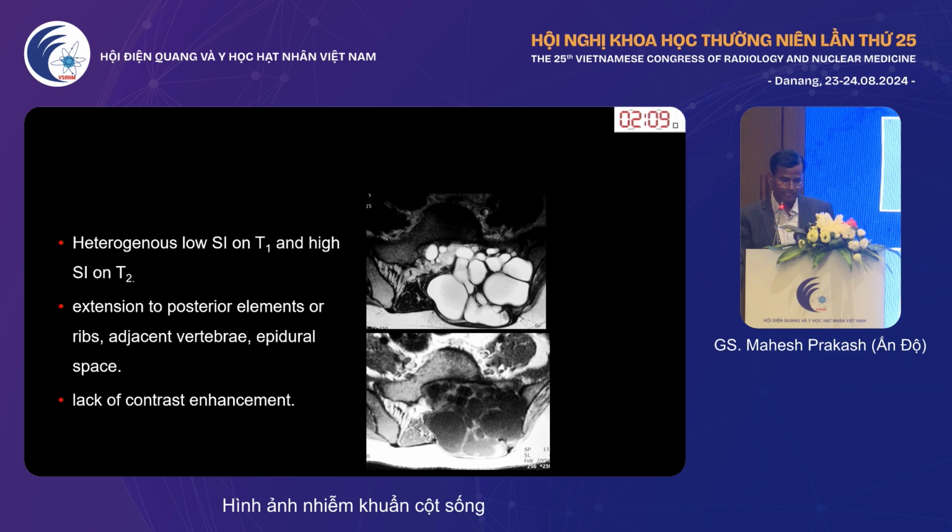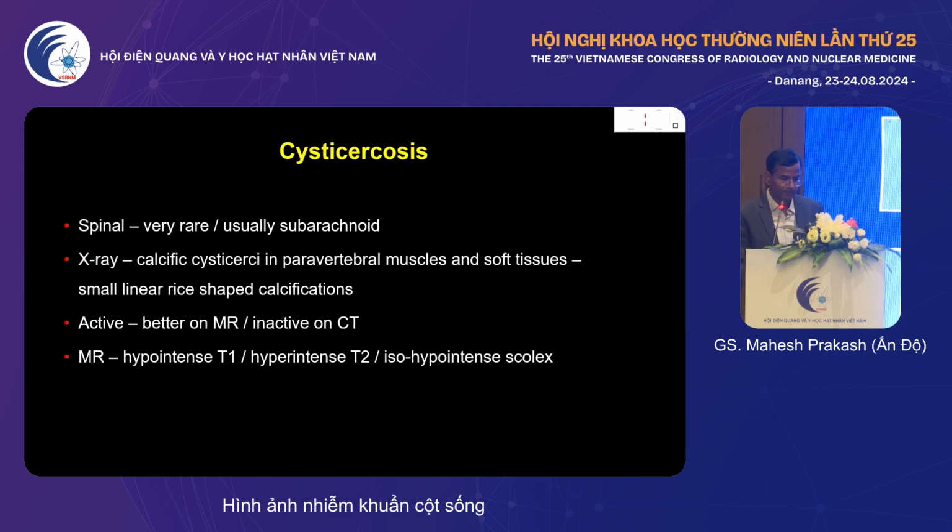So again, this is the axial image of the same patient, and you can see similar features as in a liver cyst or any other hydatid cyst. So similarly, the imaging features are nearly similar.